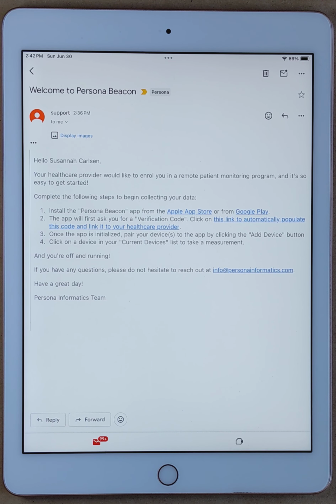Welcome to this training video on installing and configuring Persona Beacon. We're doing this demonstration today on an iPad, but the same set of steps can be used for an iPhone, an Android phone, or an Android tablet.